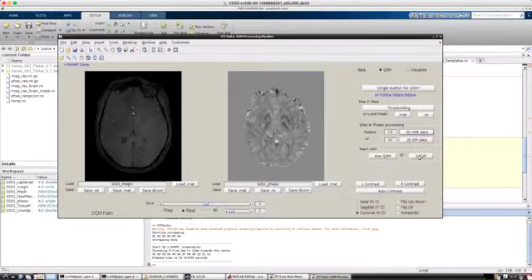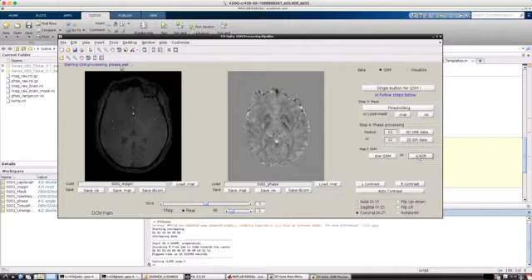So in this case, I'll just click on it, and then we'll just wait for what happens. It says starting QSM processing, please wait, and it says running iLSQR method step 1. It has 2 steps, and you just have to wait until it finishes. And then after this finishes, we will run star QSM as well, but let's wait for this to finish.